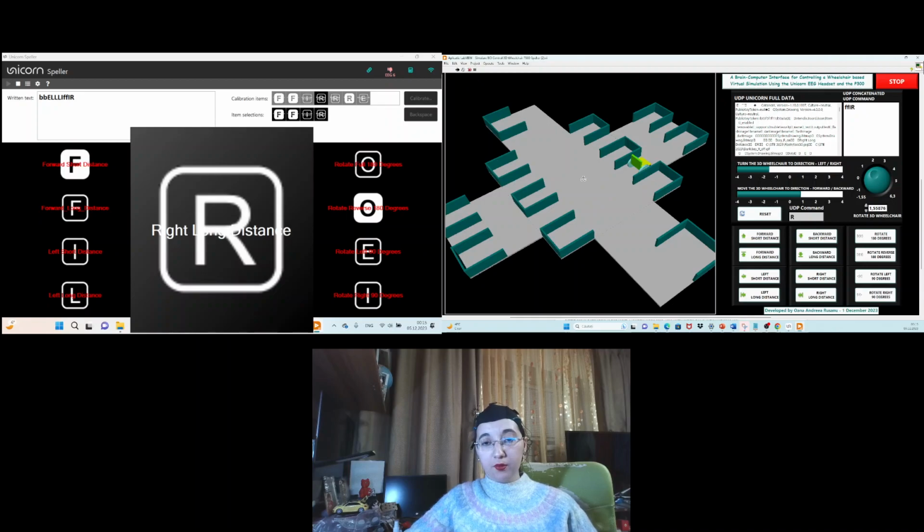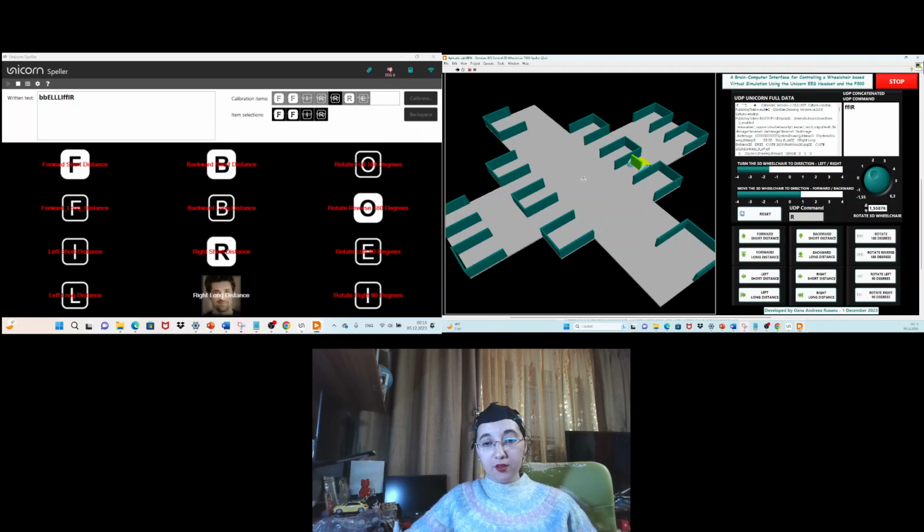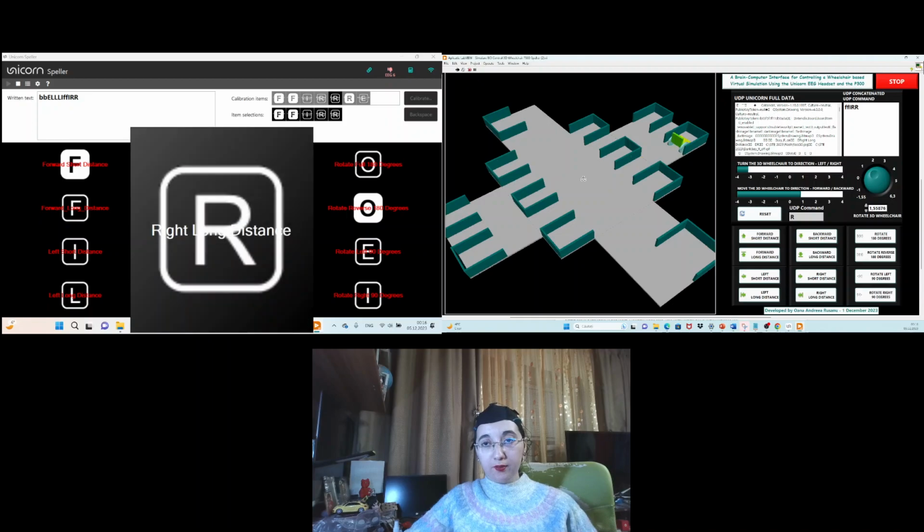Let's perform again the same command, right long distance. Great.